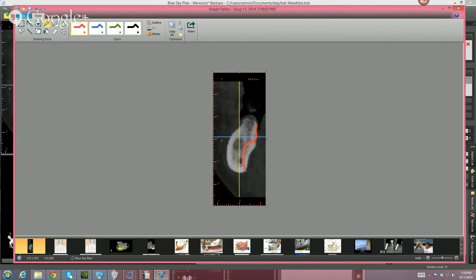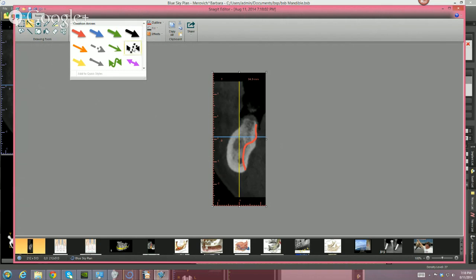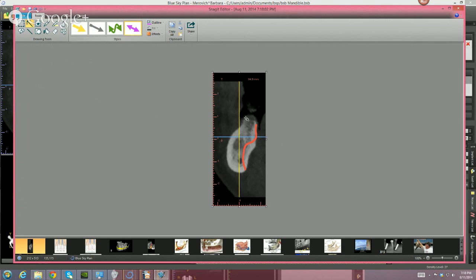Anyway, sometimes what happens is the submandibular fossa looks like that. And when you look at the regular X-ray, it looks like the amount of room you have is pretty significant. It looks like you have all of this room to put an implant in when you look at it from this point of view. Your eye is here.